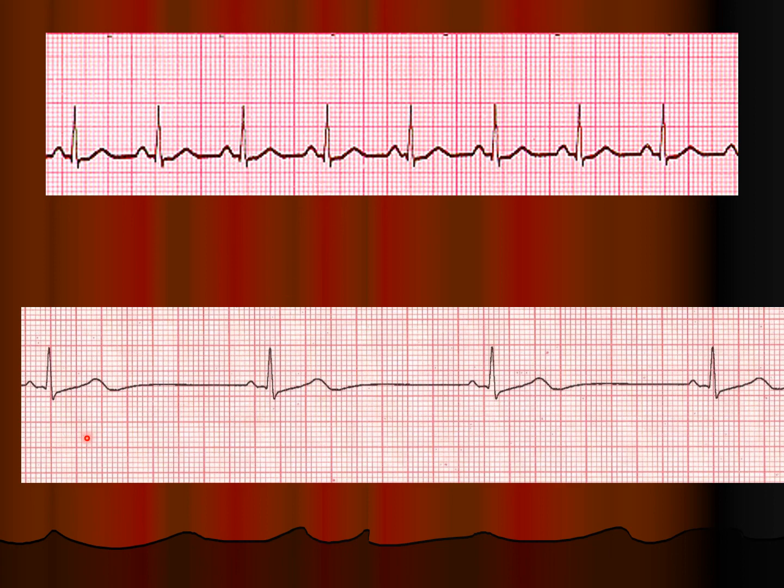Down here, we have a nice upright P wave, a nice skinny QRS. We do have an upright T. It's kind of far away. That's for another class. And our rate's about, well, let's count it out, because that seems awfully far away to me, right? So let's count all these little boxes: 5, 10, 15, 20, 25, 30, 35, 40, 43, right?